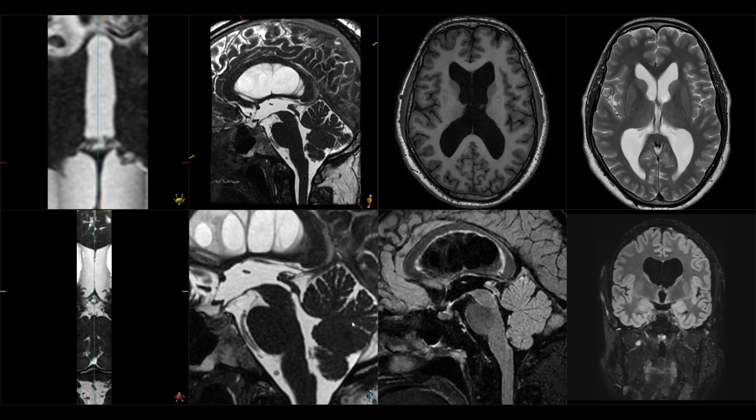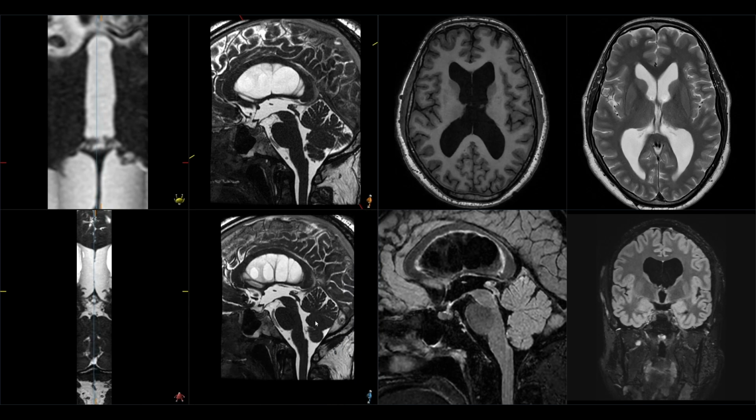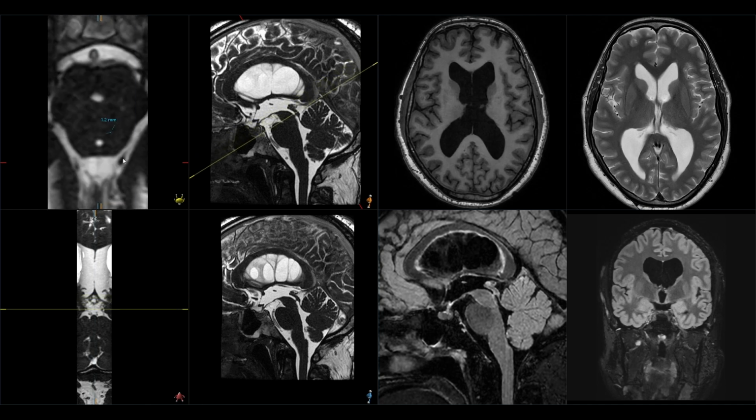We also have to look, in case of hydrocephalus, at the posterior fossa, the location of the cerebellar tonsils, if there is an ectopy, and the location of the mesencephalon, if it's sunken or not. In this case, everything is in the normal position. Okay, that's it, the aqueductal web case presentation.